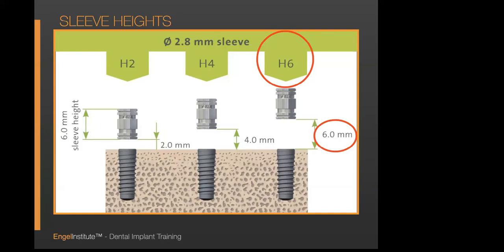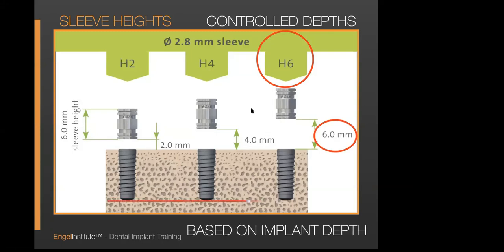Okay, well, there is a big deal, because when we do guided surgery, you know how we do crown down? Well, all guided surgeries do apex up. So what we want to do is start with the bottom of the implant. So where does the implant need to be at the bottom based on the size and the length that you have chosen? And now let's work up. Where is the bone? Where's the tissue, et cetera. So essentially, all the algorithms are going to give you the shortest amount of space to put whatever length implant you want in at that length of that red line.